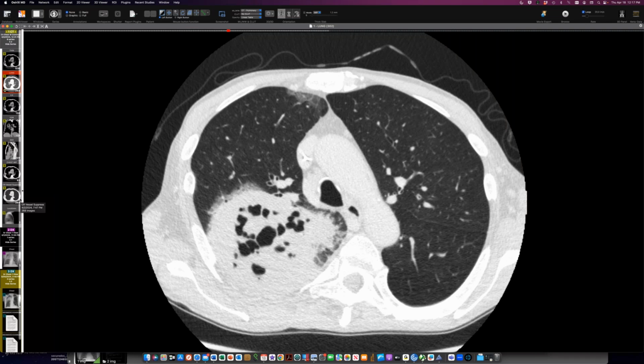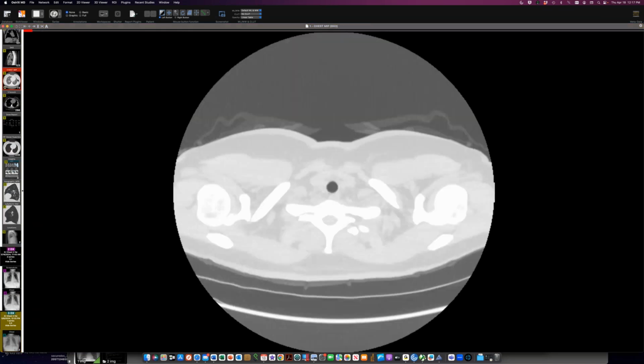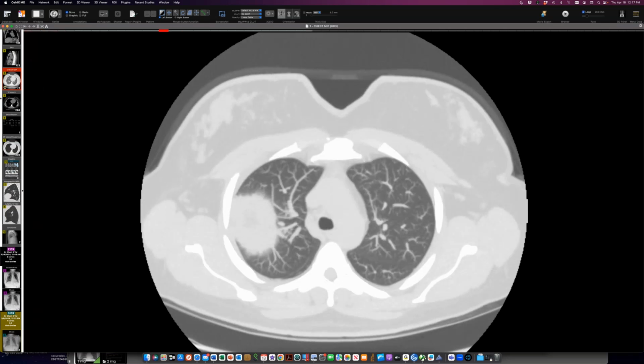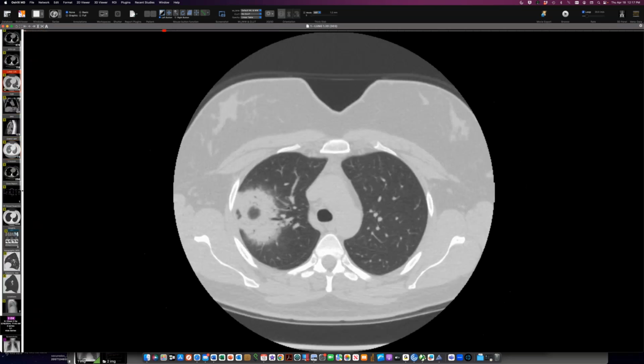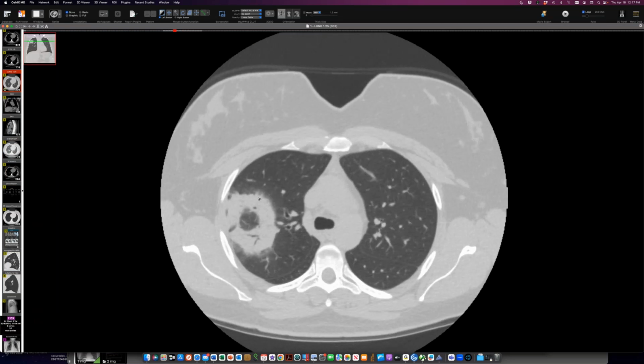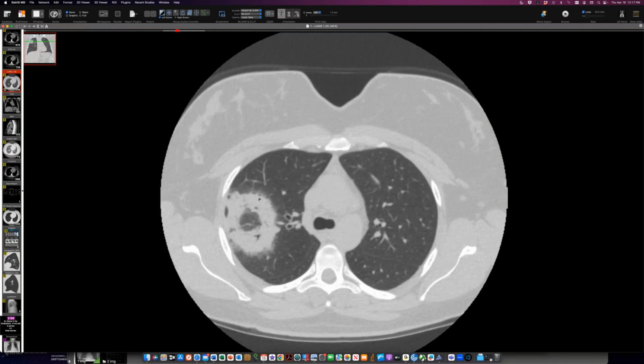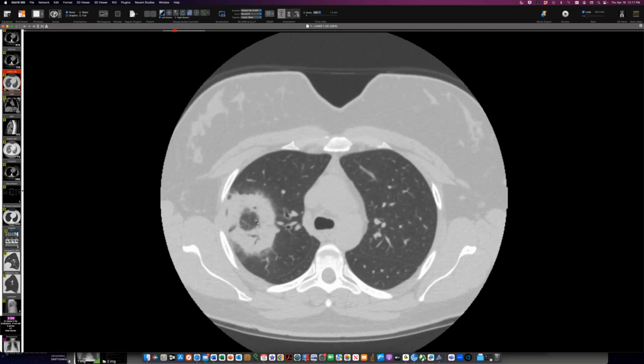then this person has a round lesion in the right upper lobe with necrotic looking center, definitely not normal, and is not really having any symptoms from this. So this is kind of surprising. This is not a stem cell transplant patient. Person got a CT scan, and let me give you a better lung window. Here we have this consolidation with air bronchograms, which I believe is rare in fungal infection to have nice air bronchograms, and does have that sort of center of preserved looking lung here.